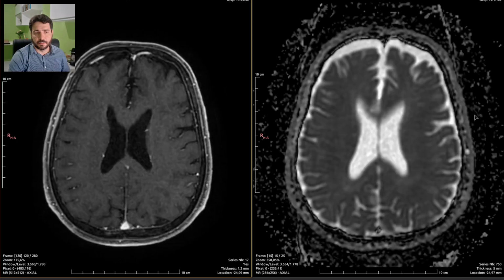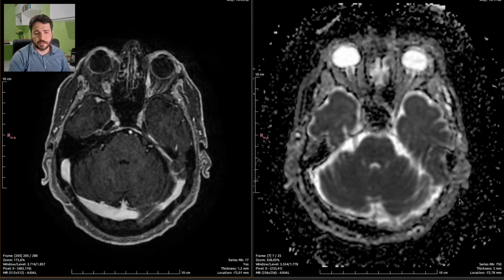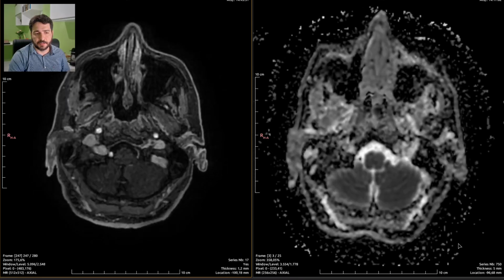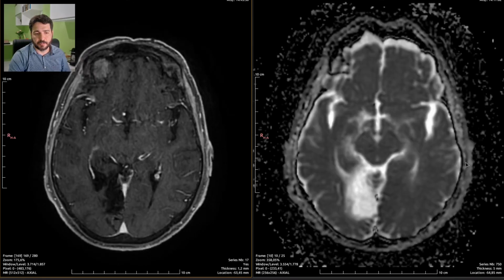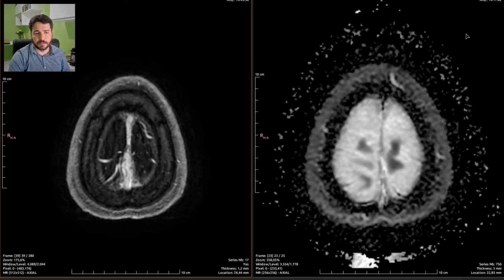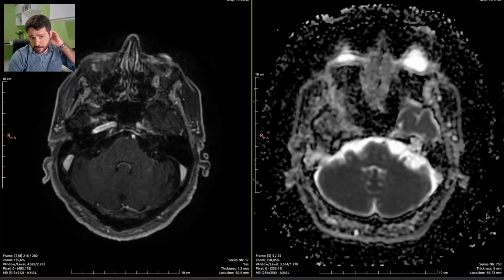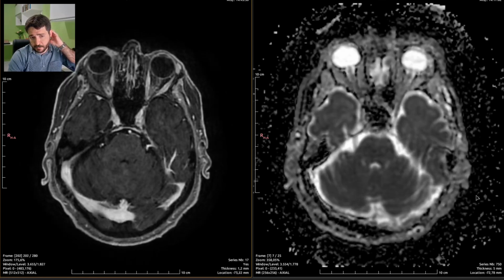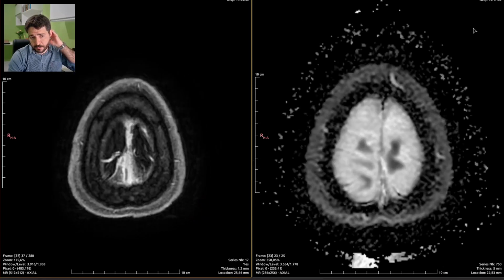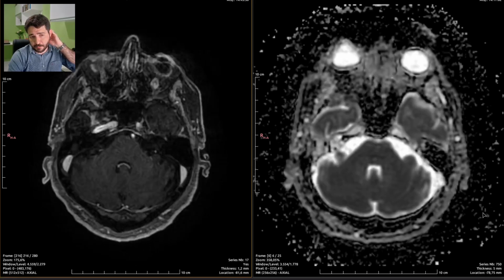So there are some movement artifacts. Contrast enhancement in such cases of stroke follow-up is not needed, so this is a spurious sequence that took a lot to be acquired and has no additional information for us.